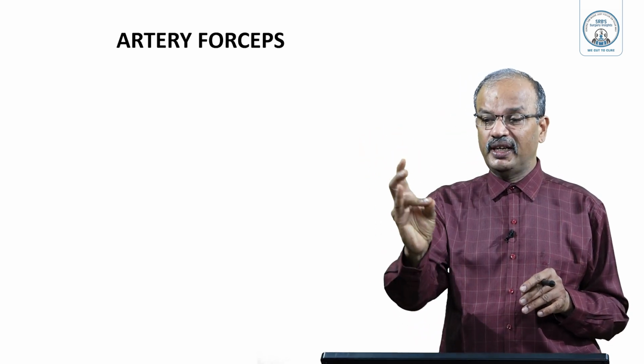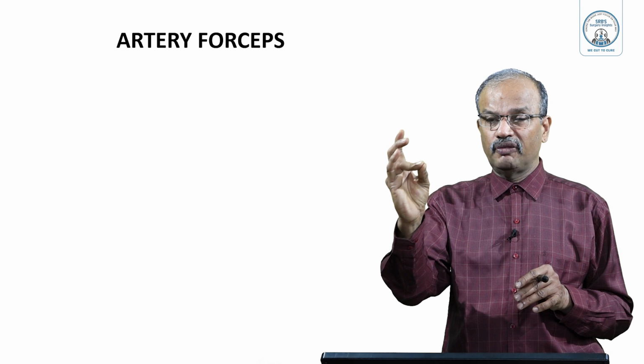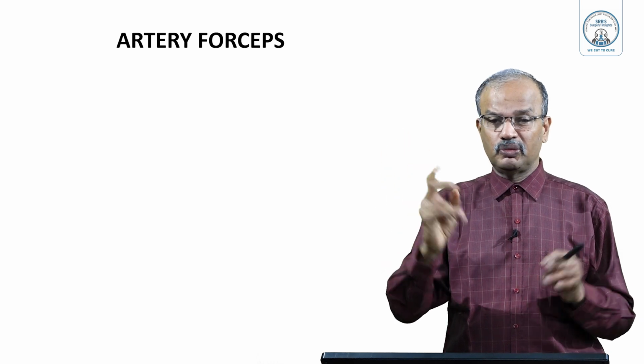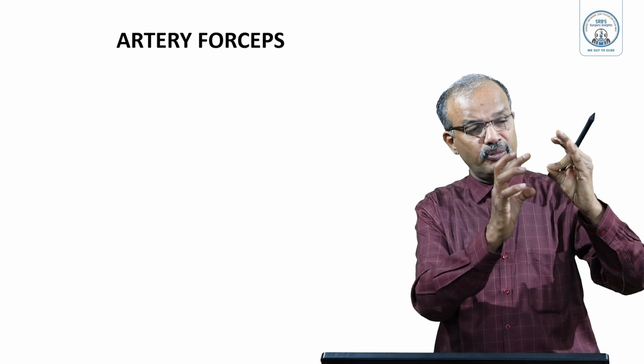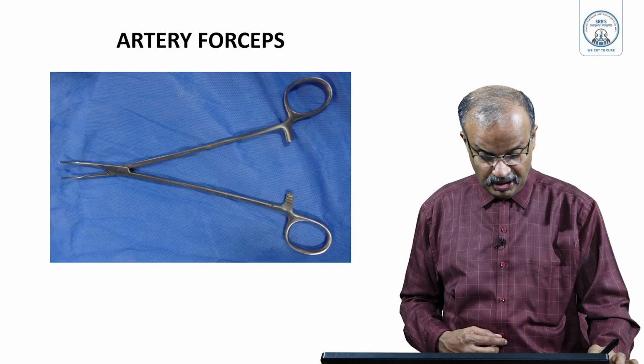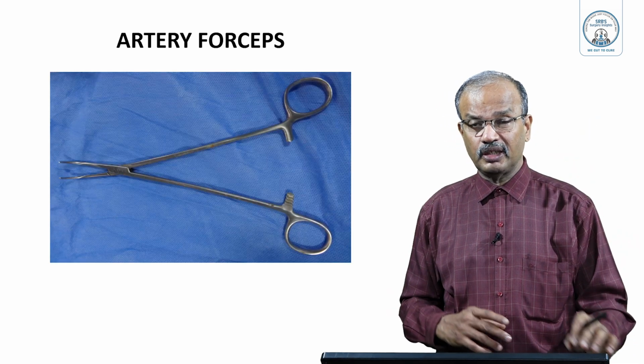Artery forceps should be held between the thumb and ring finger. Always, all instruments should be held with the thumb and ring finger. The surgical fingers, thumb and ring finger, remember. So this is the artery forceps, medium-sized curved artery forceps.